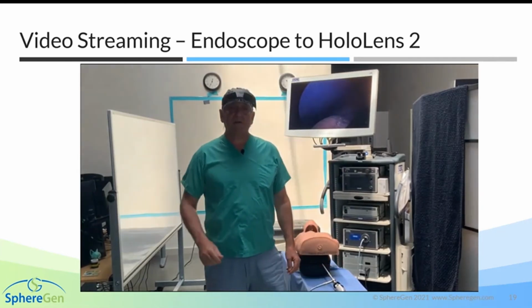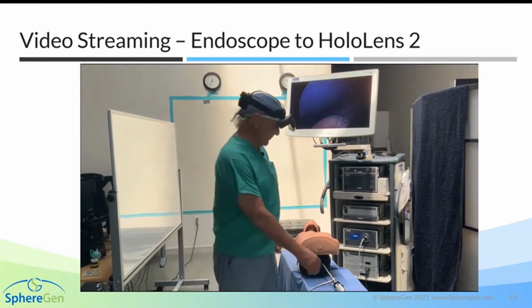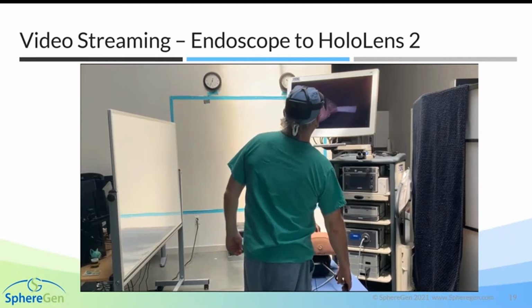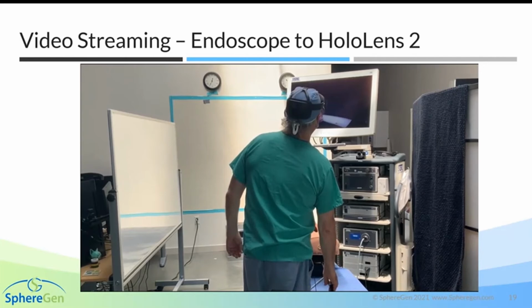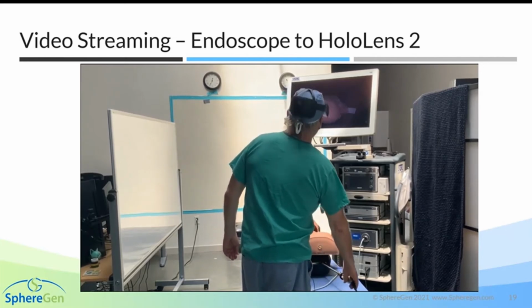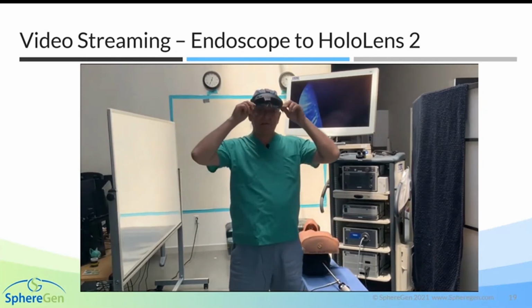So what I'm going to do, we've made our little laparoscopy dummy setup here. This is an actual real cart with a 4K screen. And so here's my scope. We've got a rubber kidney inside a black box. And what I can see, and you can see fairly well, is that there's excellent visuals. The clarity is perfect. The lighting is perfect. It really is a really great view directly through the scope.